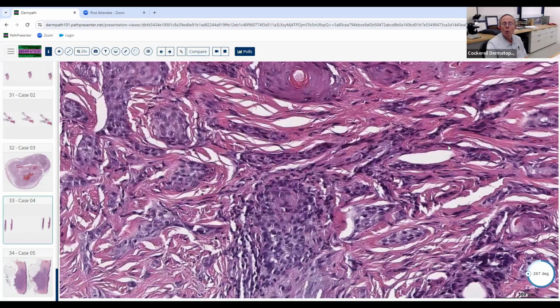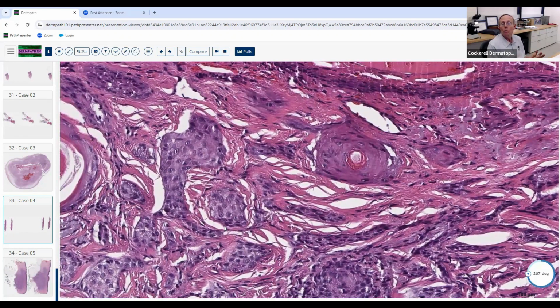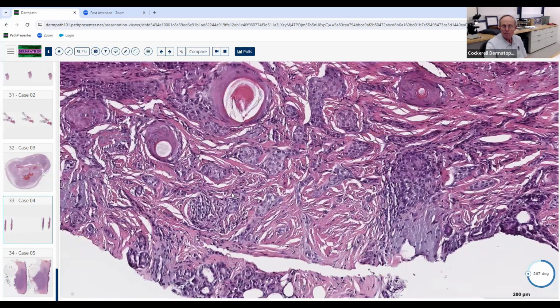The other two are desmoplastic trichoepithelioma, where you get more cysts, more follicular differentiation, calcification, and then morpheiform basal cell carcinoma, with basaloid aggregations with clefts between the epithelium and the surrounding stroma, which you don't see here so much. So this is microcystic adnexal.